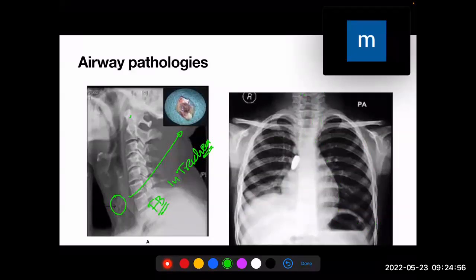The trachea started up here, then came this way. Then there was a trachea. Do you still feel it in the trachea, or is it a bit lower? Right bronchus. Thank you. It is in the right main bronchus. Are we all of us agreeing? We move.